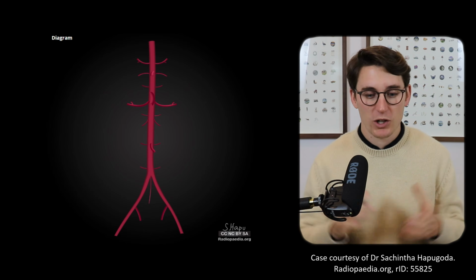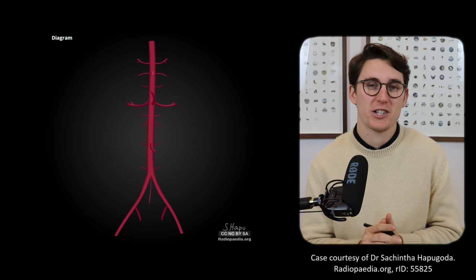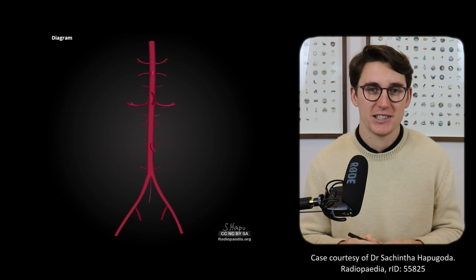So what I want to do today is, before going through the CT scan, before going through each of the major branches, I want to just draw where the major branches go, and then we'll have some understanding before we head into the CT scan.